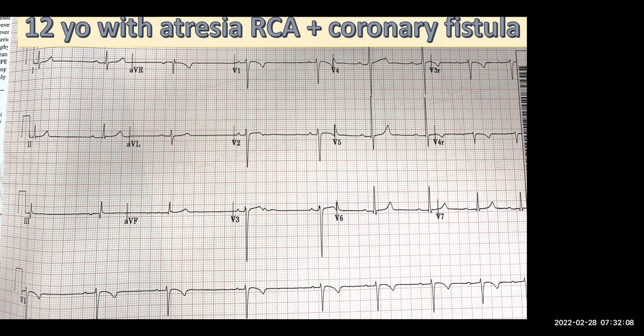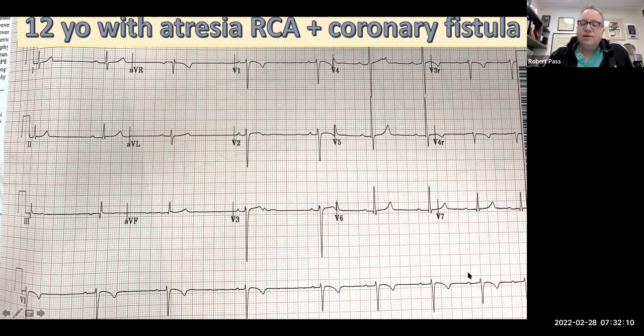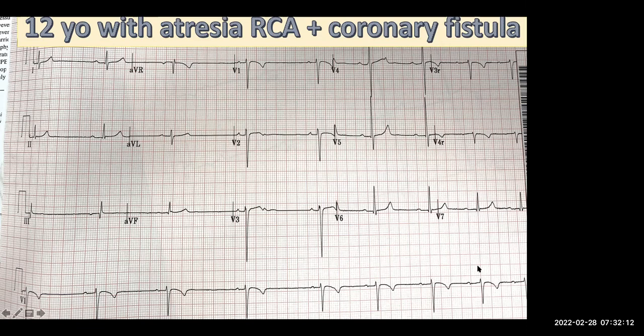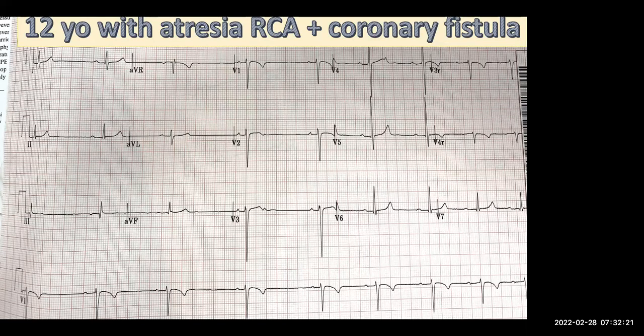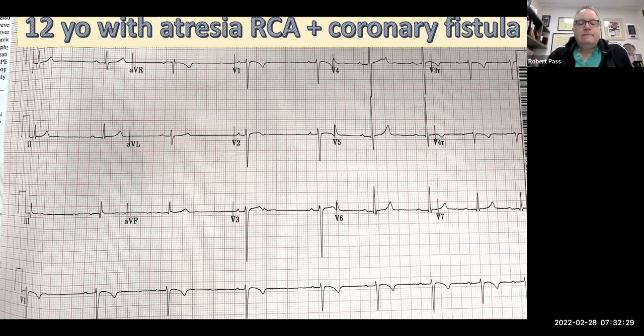Do you notice the PR interval? What's going on with the PR interval? Yeah, the PR interval seems to be lengthening there. Not enough for me to see. The strip doesn't go far along for me to see. But even if so, it would be Mobitz 1 happening there. I agree. It looks like we're about to have an episode of Mobitz 1 there.